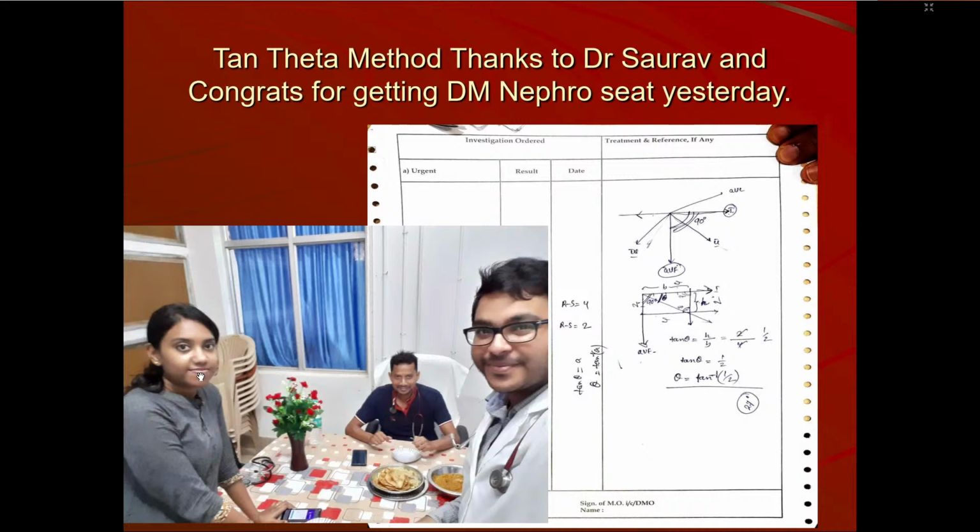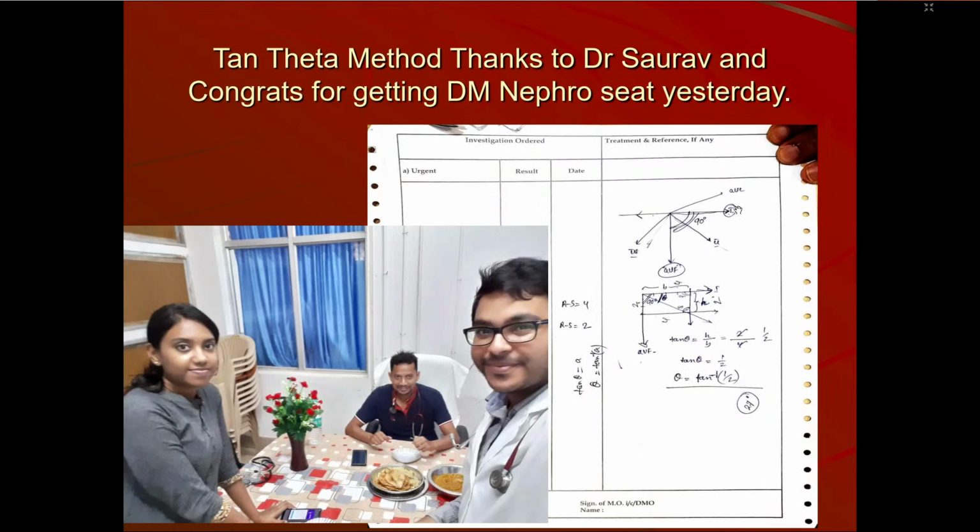Okay, so this is Dr. Saurav, and he had taught me the tan theta method. So I always show his picture whenever I discuss the tan theta method. In the tan theta method, let us say lead 1 is positive and lead 1 is, let us say, 2 small squares, and AVF is 4 small squares positive. Basically 2 by 4 is 1 by 2. So we have to calculate this theta, this angle.